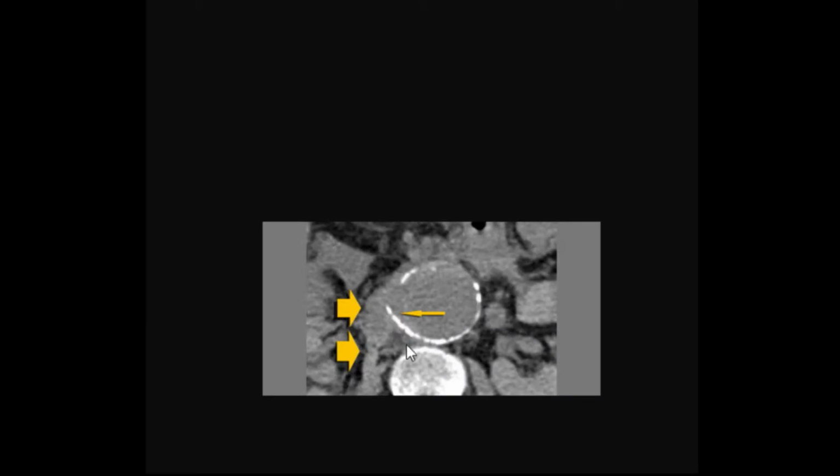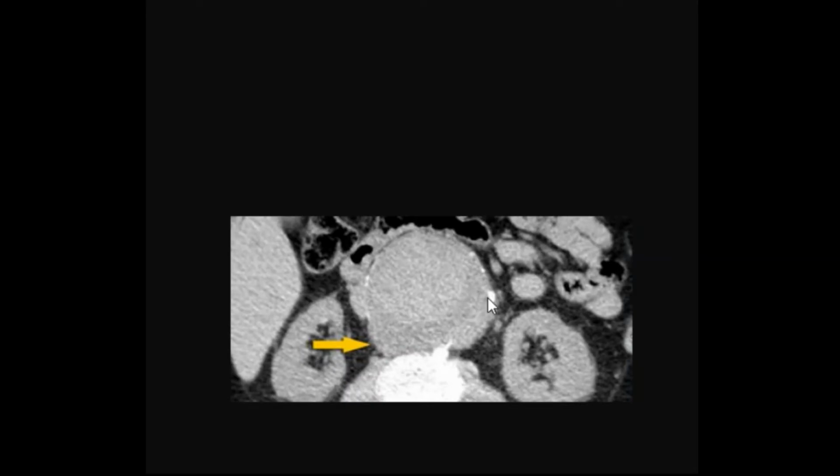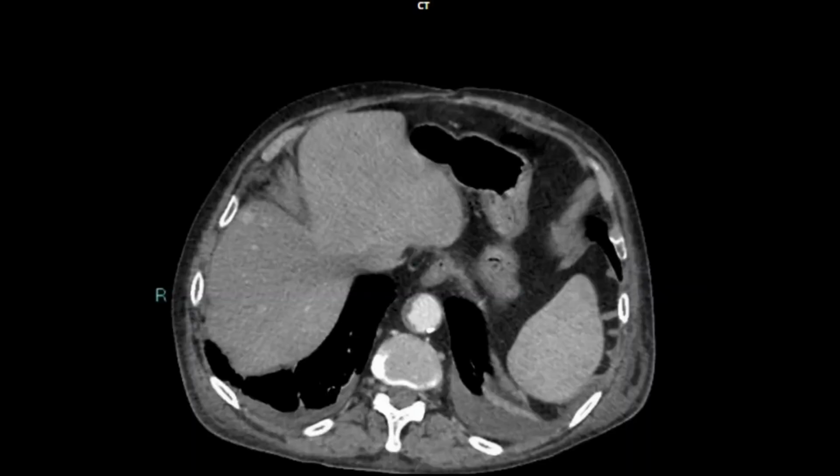Another example of the tangential calcium sign. This is the draped aorta sign, also indicating compromise of the integrity of the vessel wall. The wall should normally contain the contents and have some integrity to it, but the wall is now conforming to contours of adjacent structures. So this implies compromise of the integrity of the vascular wall and is indicative of impending aortic rupture.